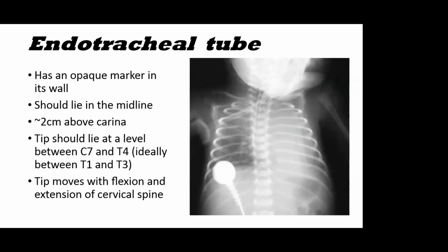wherever the carina is, approximately 1 intervertebral disc, or one vertebra above the carina, the tip should be placed. And the tip should lie at a level between C7 to T4, ideally between T1 and T3.